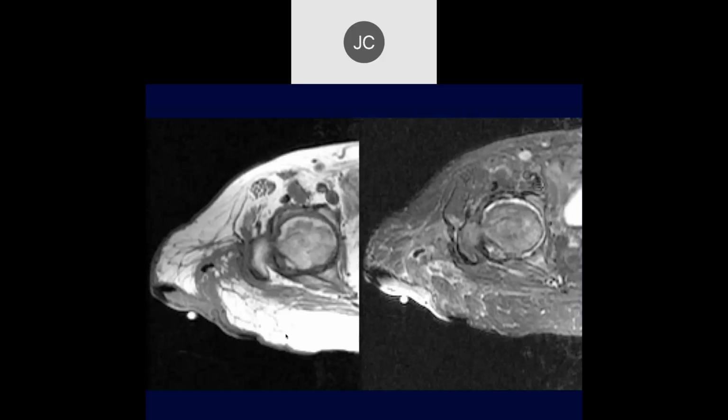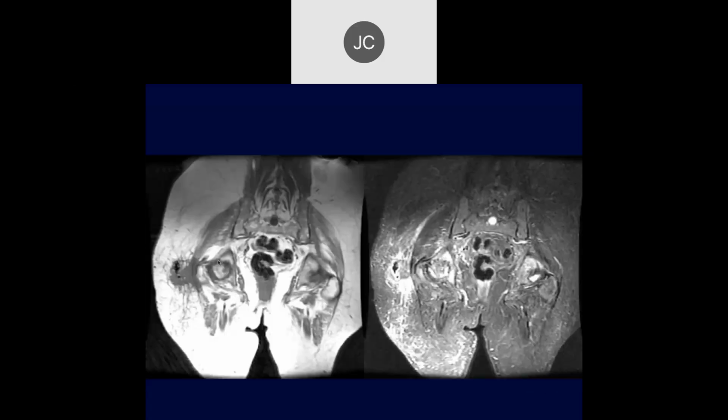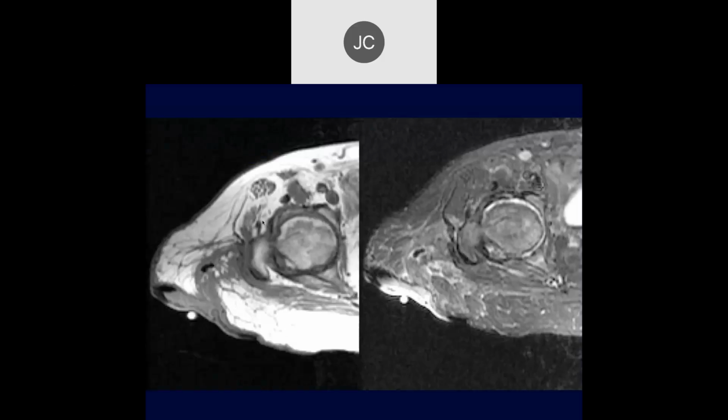Okay, so I see soft tissue thickening and scarring in the posterior thigh. Does that look like a sinus tract to you? Not sure. So really, this was an elderly cachectic lady who was bedridden.